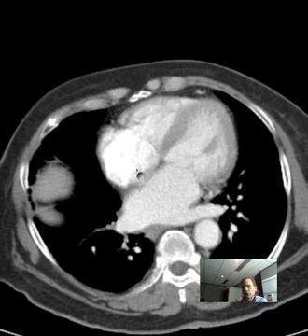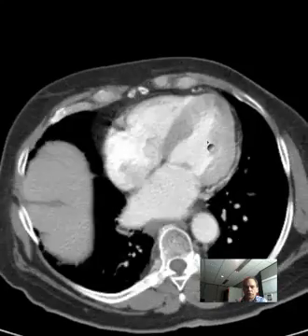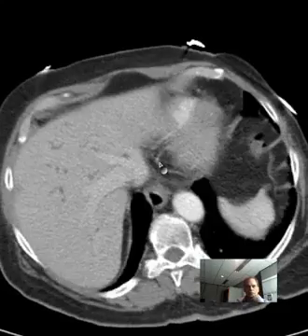If you're looking at the atria and you're not sure which is which, the left atrium is going to be receiving oxygenated blood from the lungs, and so you will see pulmonary veins coming in from the lungs to the left atrium, which then goes to the left ventricle, which subsequently goes out the aorta, of course, to the entire systemic distribution.